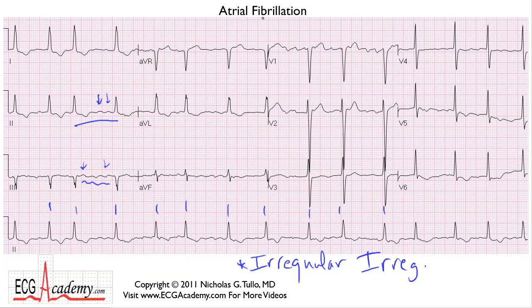Remember, the difference between atrial fibrillation and atrial flutter is that in atrial flutter, the signal is going round and round in a circle, or less often, there's a focus that's firing rapidly and the signal is spreading rapidly across both atria in a very consistent manner. Either one of these situations gives rise to a very discrete, very reproducible, very consistent atrial signal that is regular and each beat looks the same. These flutter waves should look the same in the same lead over time.